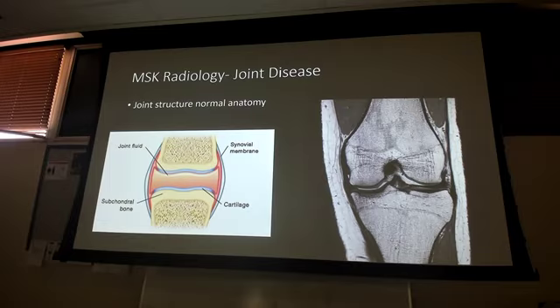MRI or CT? Think about it. MRI. MRI might be, but what other clues are there? Look at all of my cartilage and some of the menisci that I can see. I can see the soft tissue really, really well. On top of that, look at my subcutaneous tissue, how it's bright white and then the muscle is that darker color. I got the two different colors. In CT, all that soft tissue is just gray. It doesn't have any difference like it does in the MRI.